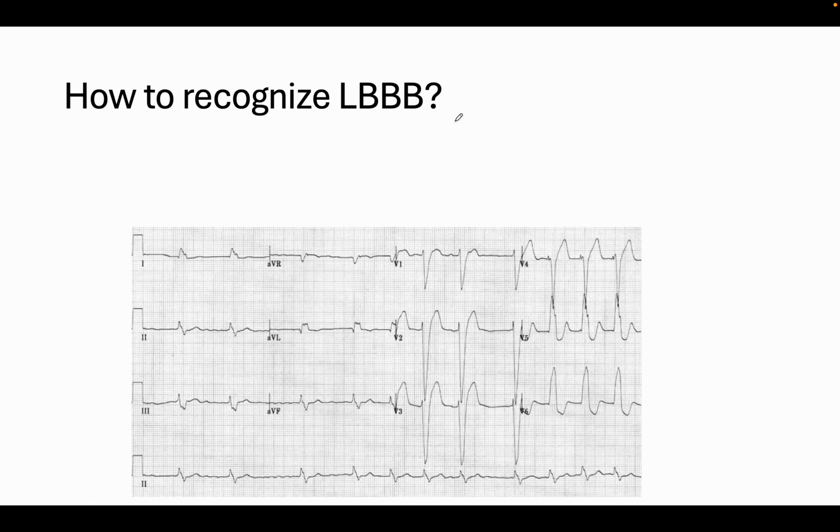So how do you recognize left bundle branch block? So left bundle branch block, when you see it enough times, it's smack bang in your face. But basically, again, you look at V1 and you'll see this RS pattern.